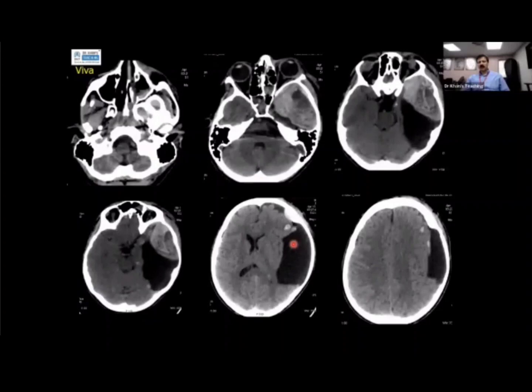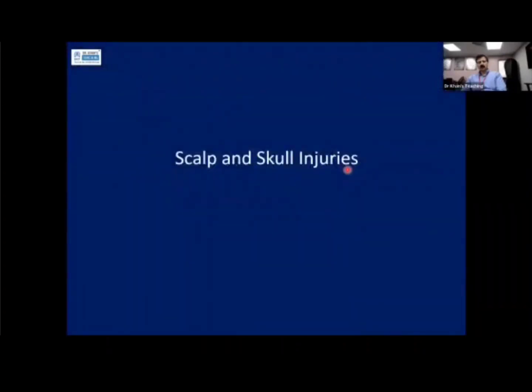With that, the patient had trauma. So there was an extradural hematoma. And with that, there were some diffuse axonal injuries. So interesting case, but I just wanted to check the reflexes. Don't jump to conclusions when you see something black, what it is. It might be fat, it might be CSF, it might be air. So ask for Hounsfield. This is a very unusual case, but I just showed you to check this particular aspect.